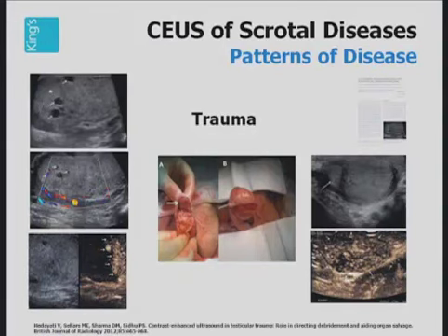The addition of contrast-enhanced ultrasound shows the fracture line, shows the upper pole avascular testes, and this is the non-viable testes. There was sufficient testes still being vascularized to allow the surgeon to remove the upper aspect of the testes and preserve the rest of the testes.